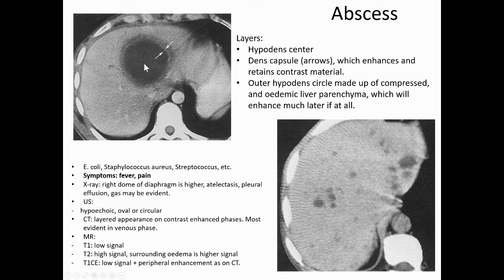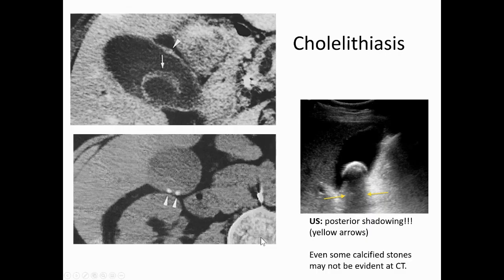lesions which are close to water will become high signal or bright on the T2. And again, the contrast enhancement is very similar to that seen at CT.